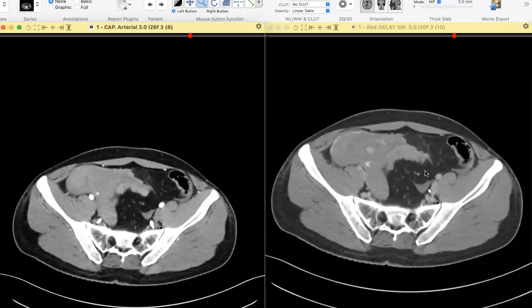Okay, CT. Yep. Can we have? Thank you so much. Malignancy of dermoid. Like I said, the potential of malignancy in a mature dermoid cyst is very low. I don't know what the signs of malignancy are, but it almost doesn't happen. It's only in immature teratoma that we see malignant transformation.